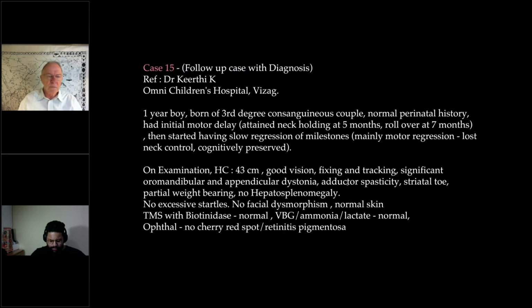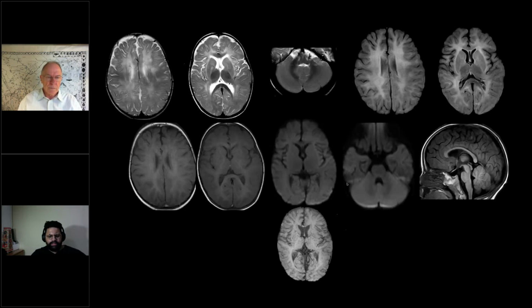So the MRI we can discuss. This was discussed a couple of meetings back. I think the differentials kept were lysosomal storage disorder, is what I remember. So you have these multifocal, more confluent areas of white matter abnormalities, also involving the basal ganglia. Some darkish appearance of the ventral thalami that probably in retrospect could be related to the hyperintense white matter causing these dark changes. But yeah, there is some degree of hypointensity in the ventral thalami.